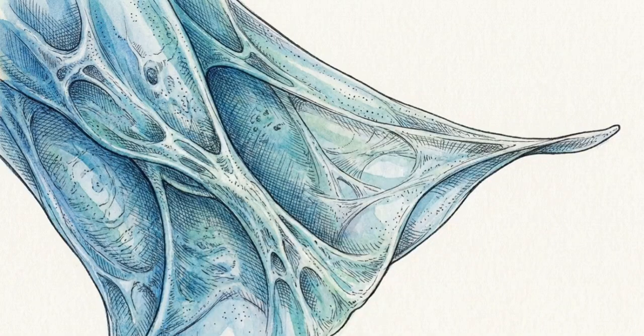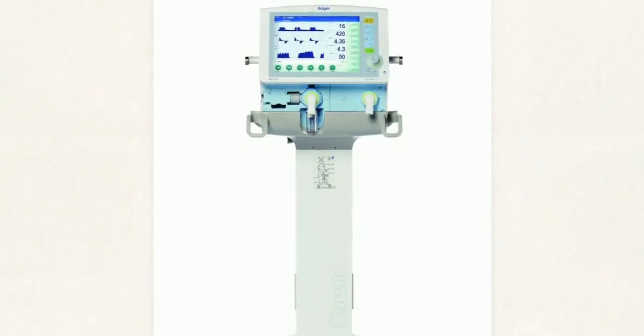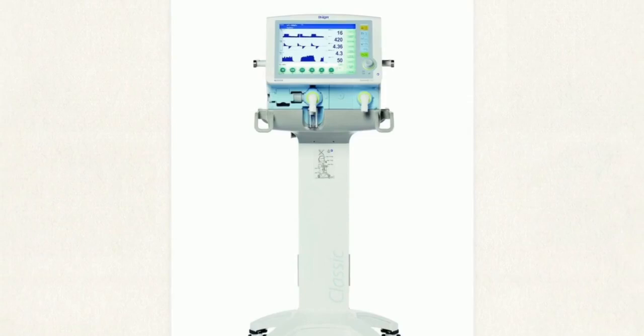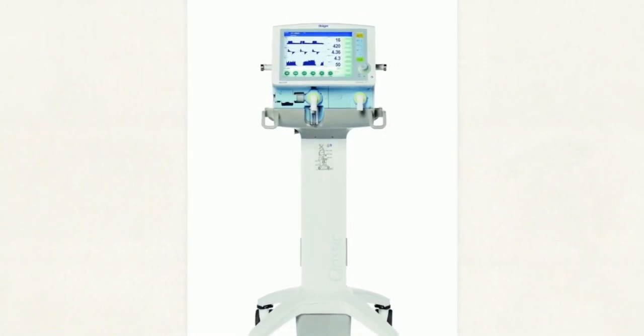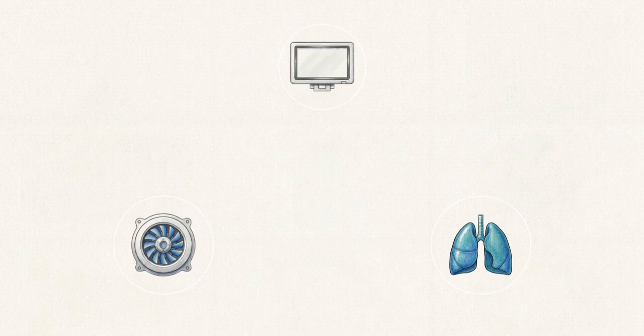Mechanical ventilation remains a high-risk intervention performed on extremely fragile human tissue. Deep familiarization with the hardware configuration is a direct requirement for maximizing patient safety and minimizing harm. As seen in this complete view of the Savina 300 Classic, the entire architecture relies on perfect synchronization. Clinical mastery requires understanding exactly how digital pixels on a screen, internal pneumatic forces, and physical breathing circuits all function as one.